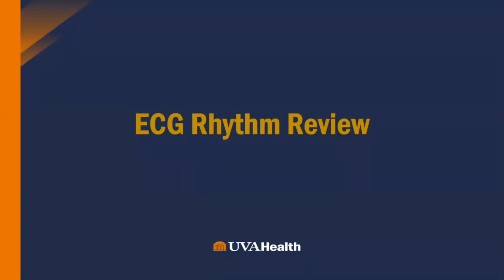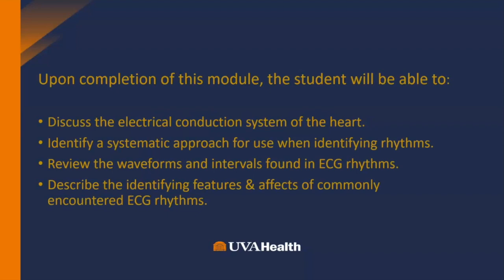Okay, we'll go ahead and get started. We'll talk a little about rhythm review. And one of the things we want to start doing is talking about some of the fundamentals of rhythm recognition.